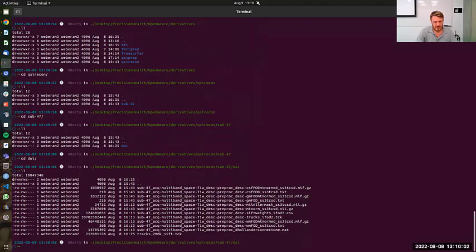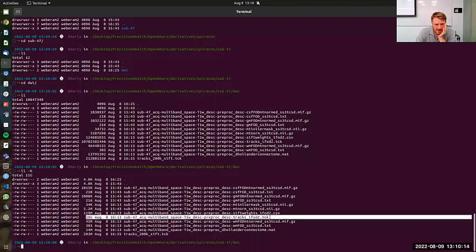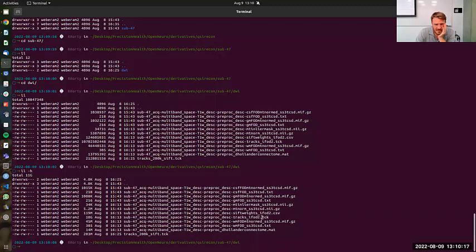I think are these files. And if you can see, the biggest file is 10 gigabytes, which is relatively big. And it is this .tck, which I think are all the tracks.